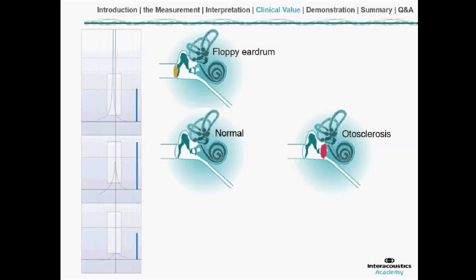And on the other side, at the same time, the same graph could mean that there is a more or less serious problem. It could be that the ossicular chain is disconnected, that there is a fracture in one of the bones. And if that's the case, usually it's easily repaired with some glue, but differentiating between the two is not possible just based on such a tympanogram. They just look the same.